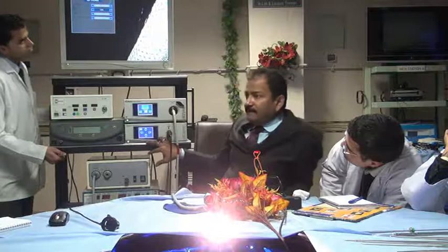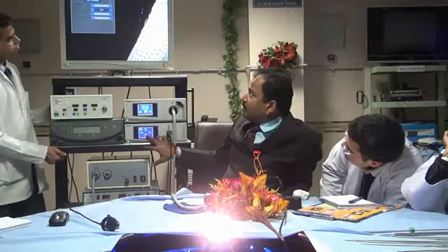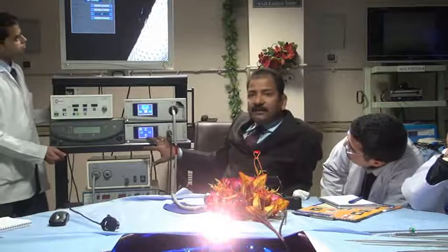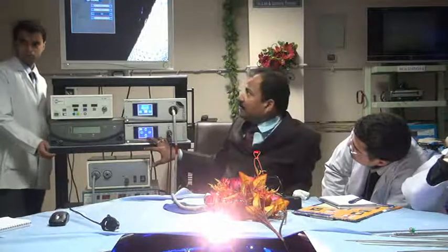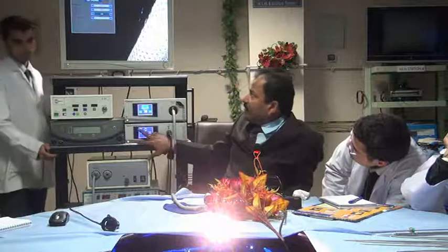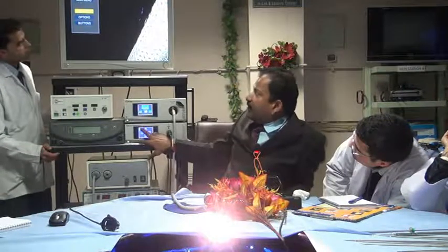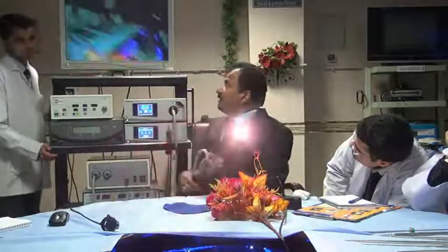This is 1080, isn't it? So this is also one of the important factors. Then the R gain, that is the red color, if it is coming very much, then you can decrease that also. Then the touch screen, sound, these are the functions which you can use. Then you have the different functions. So I will show you in a nutshell here.